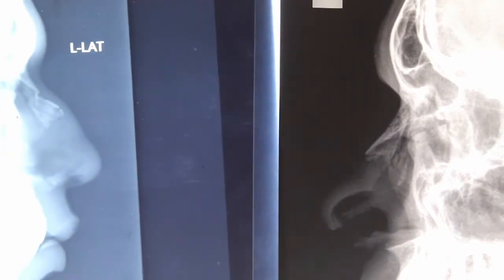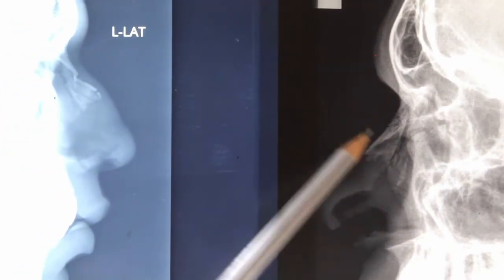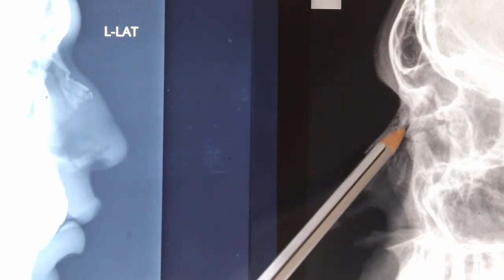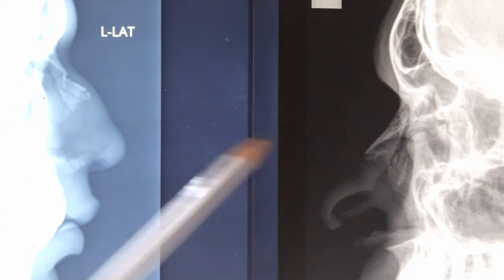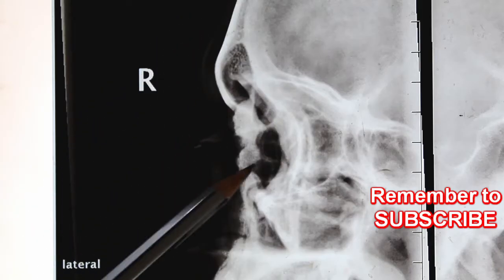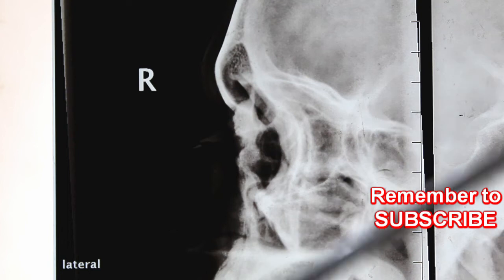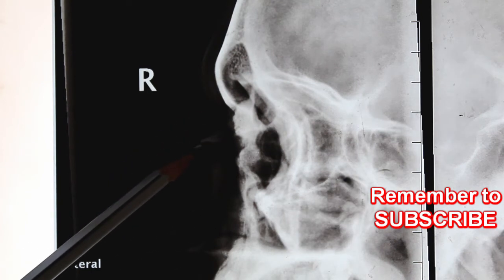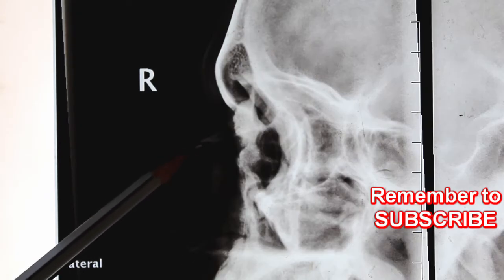Put both sides. This is normal, and this is a fracture line. So this line should not be confused with the fracture line. Okay, this again is an X-ray nasal bone lateral view, right side, left side is also there. Can you see? Here is a fracture. At the tip of the nasal bone there is a fracture.